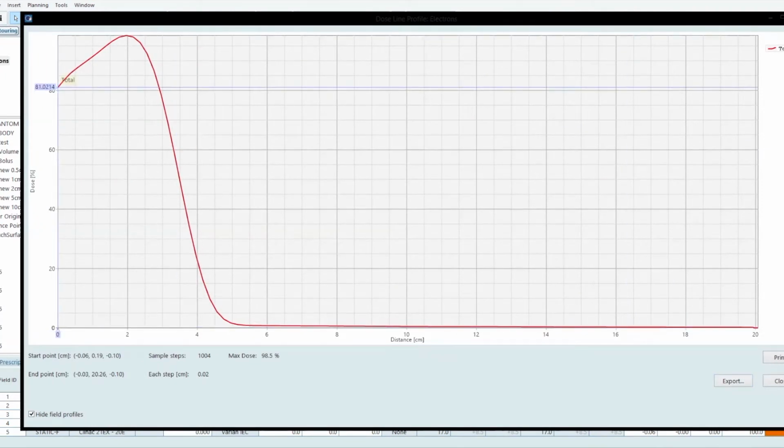Okay, look what happened to my surface dose. I'm at 81% for surface dose. My depth of maximum dose is right around 2. My depth of D90 is 2.6. My depth of D80 is 2.9. So I've gone 3 millimeters now for a 10% falloff. The distance from my prescription isodose line of D90 to D50 is 2.6 to 3.4. So contrast that to the 6E.